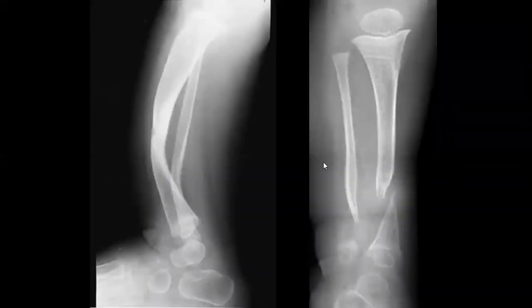Okay, let's go to this case. Yeah. Why did you go, Marwa, and say that it is neurofibromatosis type 1? I know that this is like a common picture that gives you, yes, but why? What makes you go direct to mention that it is neurofibromatosis type 1?